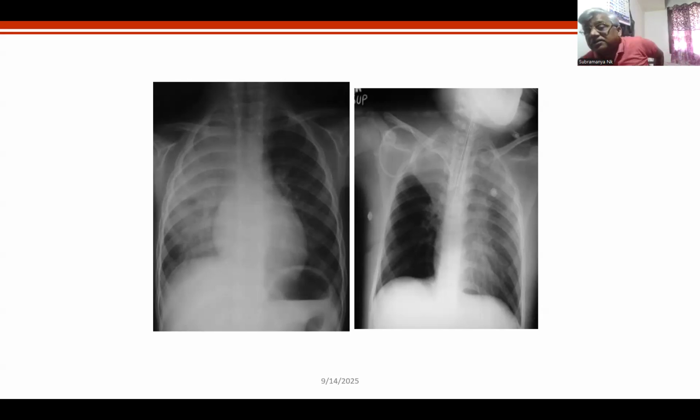However, in practice, in children, the airways tend to collapse more, especially in newborns and infants, and therefore often in practice the consolidation is associated with collapse, and we call it collapse consolidation. So you can have more radiological signs of consolidation or sometimes more of collapse. You can have a mix of both signs of collapse and consolidation. I'll go further and I'll teach you, don't worry.